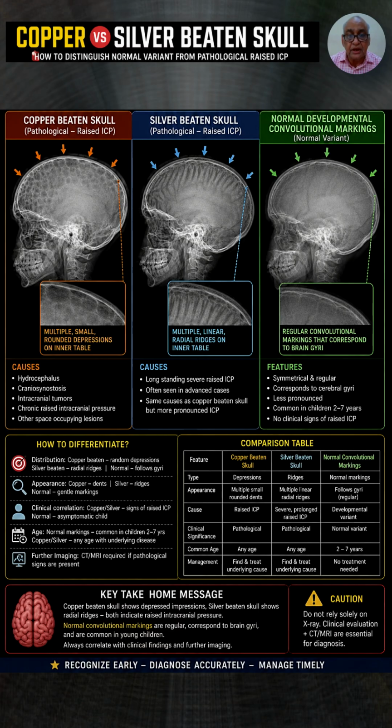The copper beaten skull is an important clue, not a diagnosis. Always interpret it in the context of the patient's age, symptoms, neurological examination, and cross sectional imaging. Recognizing this distinction can prevent both misdiagnosis and unnecessary alarm.